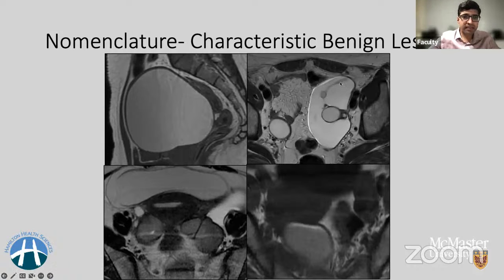If the lesion has T2 dark components, remember, you have to look at T2 and diffusion weighted imaging. If it is dark, don't consider it as solid tissue, even if it shows enhancement. It has to be a non-dark component to call it solid. Any cysts more than 3 centimeters with any type of fluid and no wall enhancement fall under this category as well. The only exception here is an endometrioma, which may show smooth wall enhancement, whereas the other categories of cystic lesions do not show enhancement in this category of O-RADS 2 lesions.